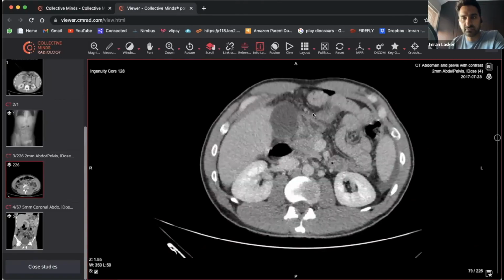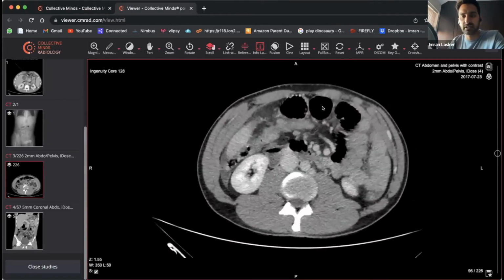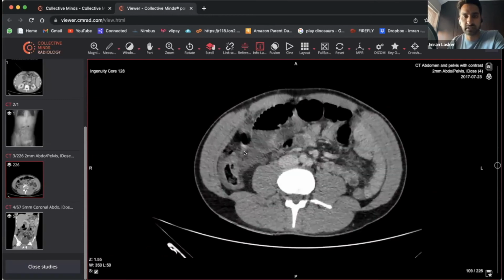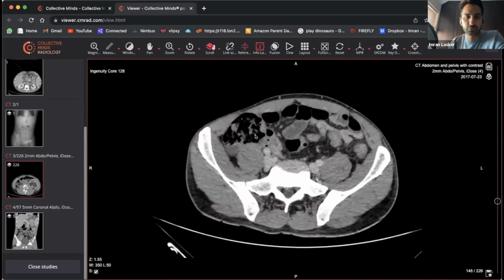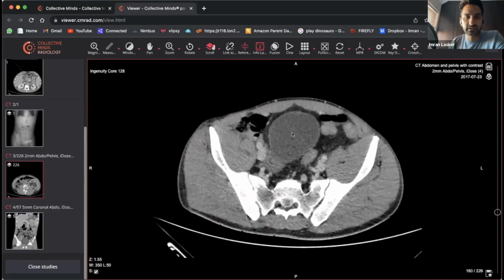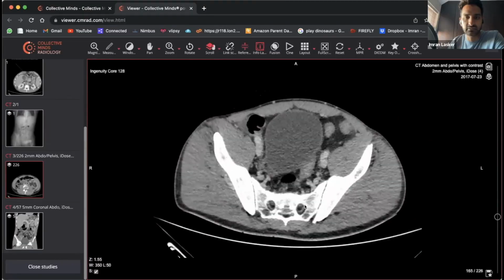We're going right across the front. Oh, we're looking like we're going behind some slightly dilated bowel. Can you see that slightly dilated small bowel? And we're creeping around the back and then going down the side, and we're coming up to the cecal pole. Now I don't know if anyone can see that, but I do wonder whether the appendix is just sitting somewhere within that region there.